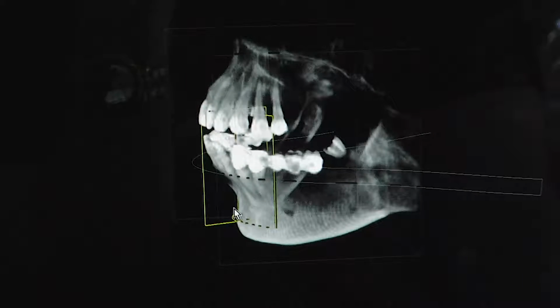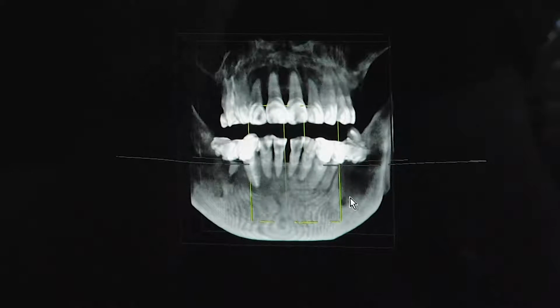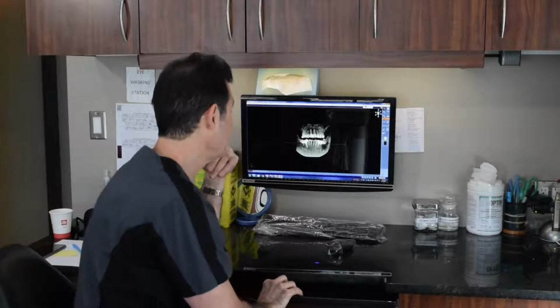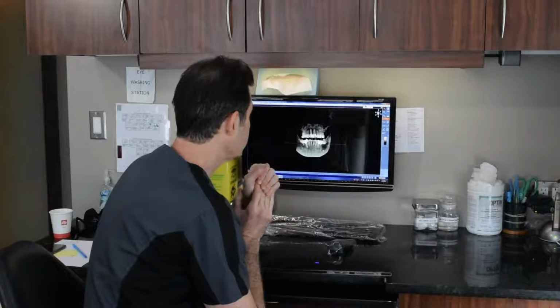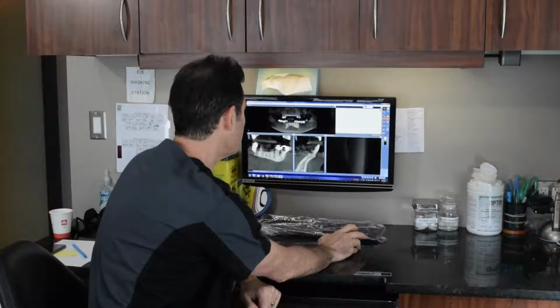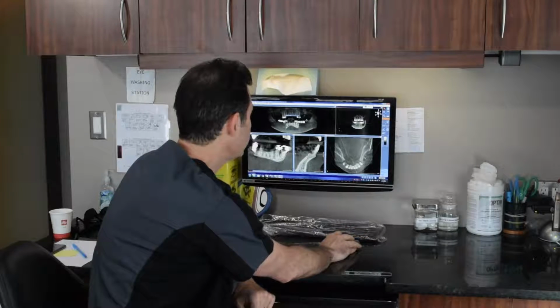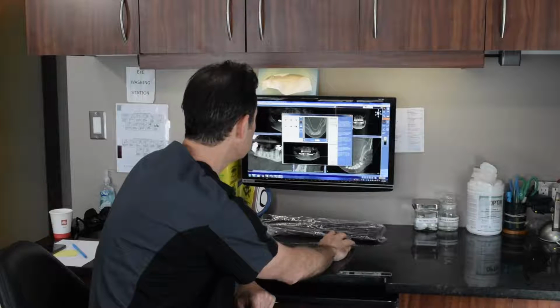Generally this is a view that patients like to see, but it's not a view that we tend to work from in the field. We work from a series of two-dimensional views that give me all of this information so that I can work with it. So if we take a look here, I'm just going to reset the positioning of the bone.